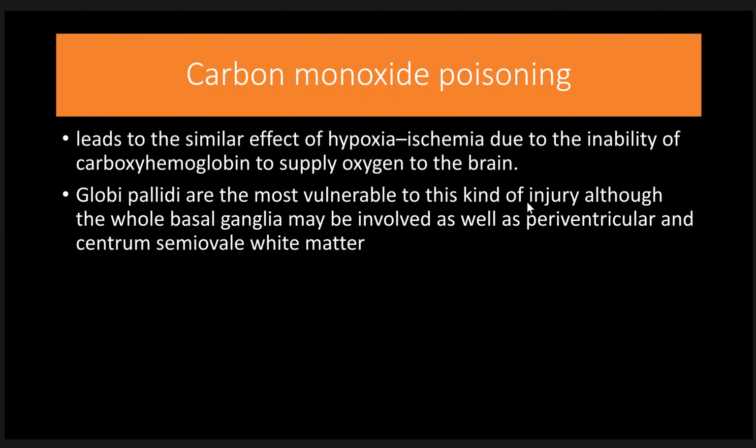Carbon monoxide poisoning leads to a similar effect of ischemia, hypoxic ischemic changes due to inability of carboxyhemoglobin to supply oxygen to the brain, and globi pallidi are the most common area involved, as well as periventricular and centrum semiovale white matter.